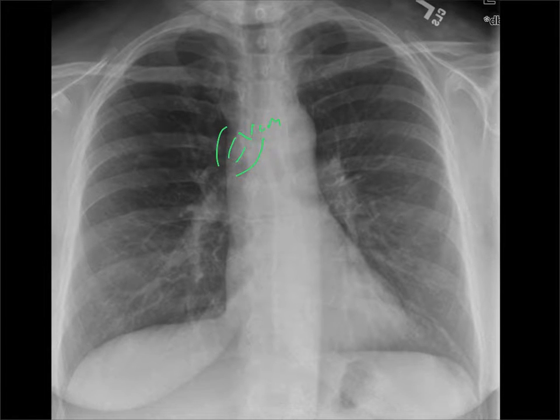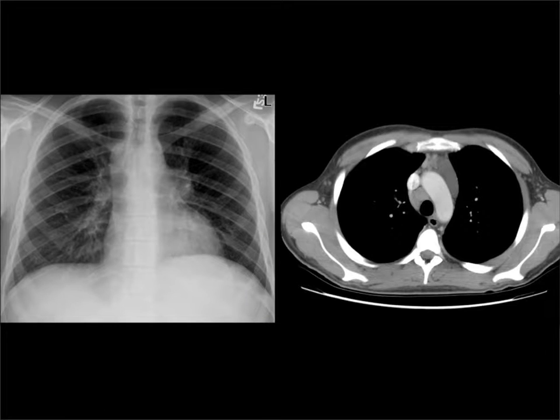There are also some unusual anomalies which obstruct drainage of either the head via the superior vena cava or the abdomen via the inferior vena cava, and nature finding a way will tend to send the blood via other routes, in which case it will send it via the azygos, and the azygos can get big and fat in that circumstance also.